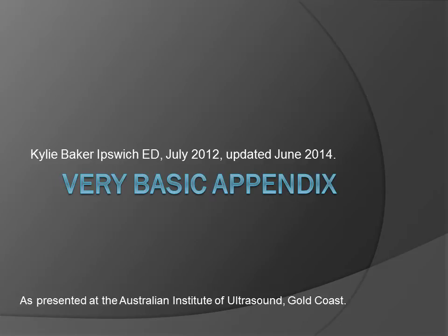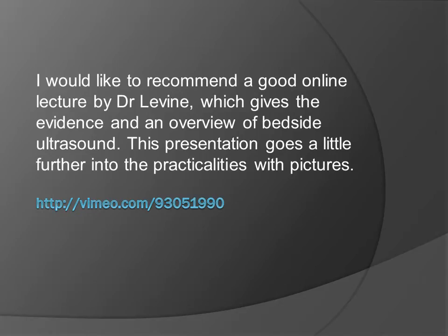This talk is simply my approach to bedside ultrasound for appendicitis. I thought I'd put these slides up after watching an excellent talk by Dr. Levine, which gives a great overview of the background and evidence behind bedside ultrasound. Can I suggest you have a look at this video when you get the chance? My own talk simply describes an approach with more pictures as to how I go about finding the appendix.